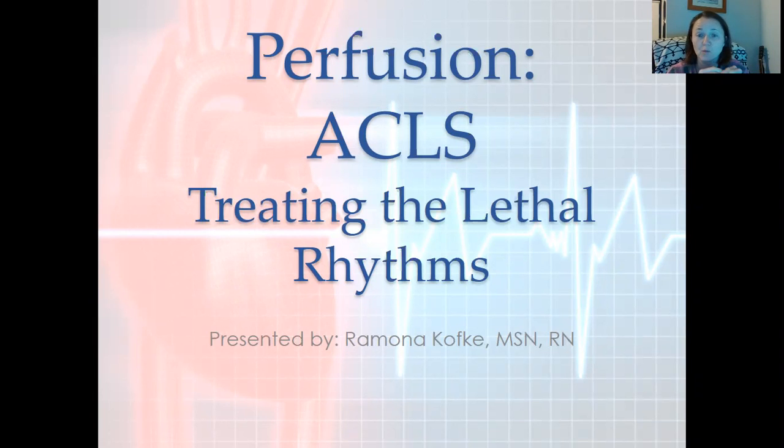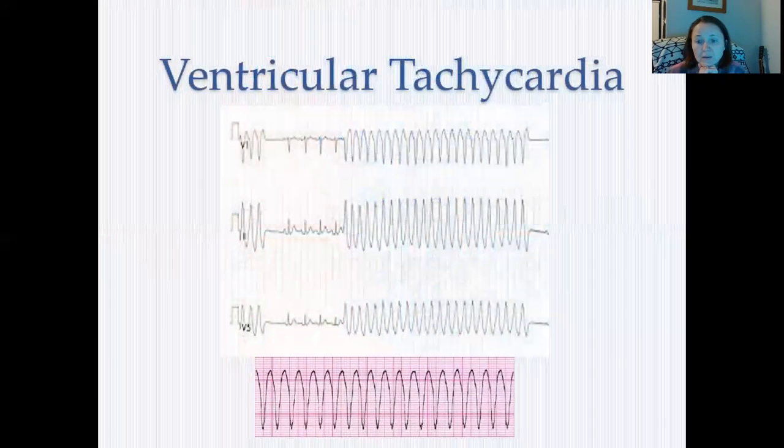So we'll call those the lethal rhythms, meaning that they are lethal and they will kill you. So we are going to look at the lethal rhythms at this time. They are going to be inconsistent. These electrical patterns are going to be inconsistent with maintaining perfusion. So our first one we're going to look at is ventricular tachycardia.